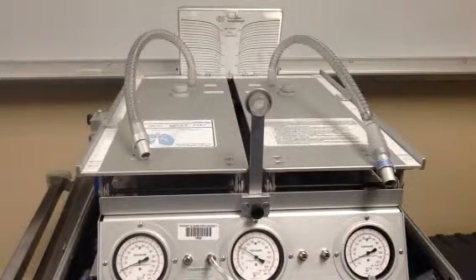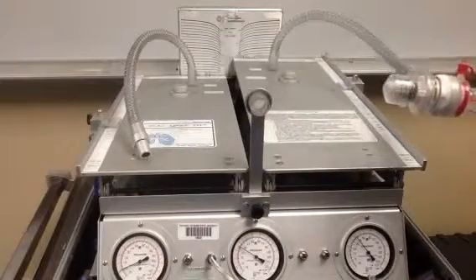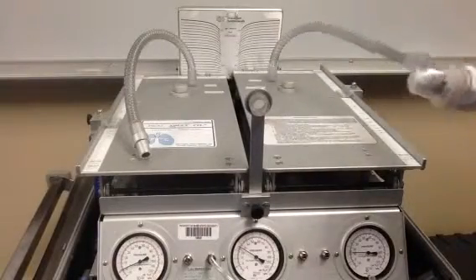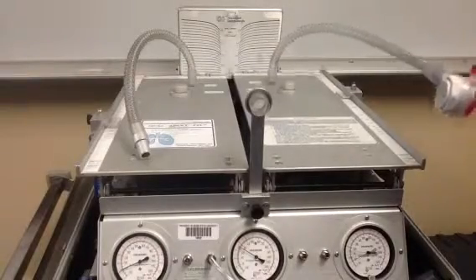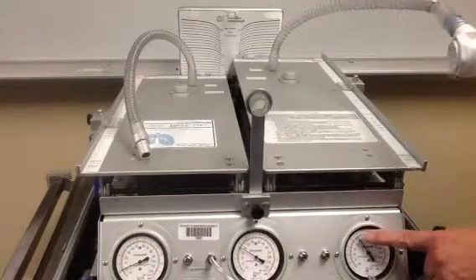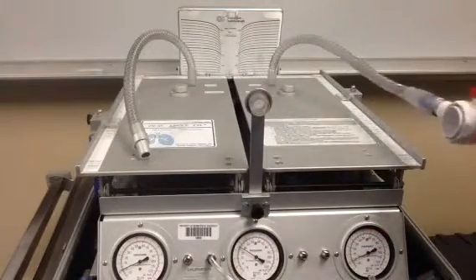So what I'm going to do is ventilate this test lung. I'm going to use a resuscitation bag. And as I squeeze the bag, you're going to notice a couple things. You're going to notice that pressure goes up. Got a pressure manometer right here, and it's indicating right now about 35 centimeters of water.